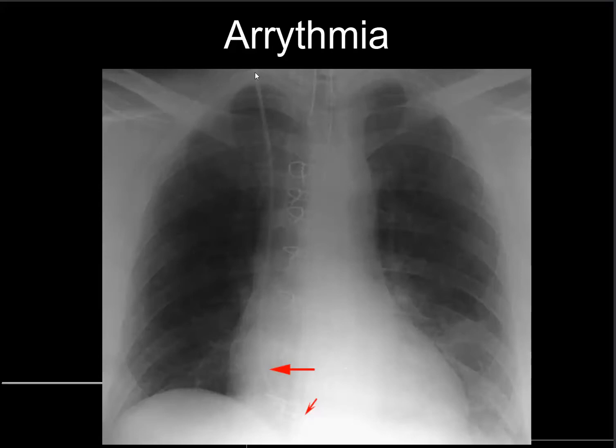What this patient actually has is an internal jugular line, which should really have its tip in the superior vena cava, but unfortunately it's too long and it's curled up within the right atrium where the sinoatrial node is, and it's basically irritating the sinoatrial node, and this patient is having an arrhythmia. This needs to be replaced or retracted or cut to the right size, and it's important for us to identify these tubes because an arrhythmia can become nasty, can become VF.